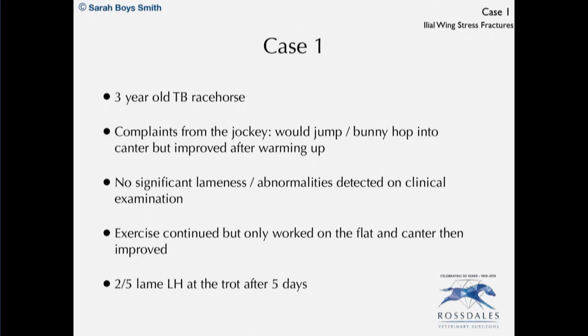So just a few cases to demonstrate the variety of stress fractures that we might be presented with, both the variety from a clinical point of view as well as from the imaging point of view. So this was a 3-year-old thoroughbred racehorse. The complaint from the jockey was bunny hopping, it would just jump around, it wasn't cantering properly. No significant abnormalities or lameness were detected on clinical examination. It continued in exercise, it was only worked on the flat, and the canter slowly improved. But after 5 days, it was then noticeably lame on that left hind.